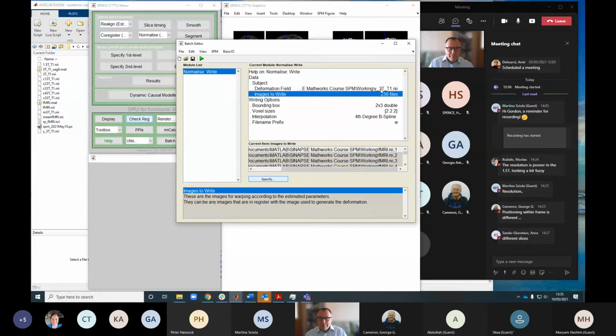That is then going to match our functional data to the template.